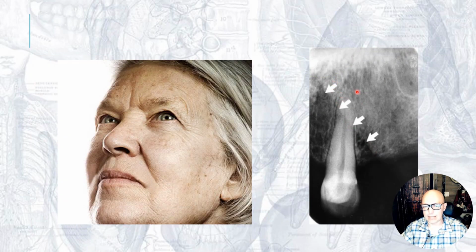We see this radiopacity as you look further distal here, further posterior in the patient. Kind of hard to tell, but just kind of knowing what this is, it can orient me to which direction this is. You can also see the maxillary sinus back here. So you could surmise that this is the left side of the patient. So that's posterior, this is anterior. This looks like a premolar here, probably a first premolar.